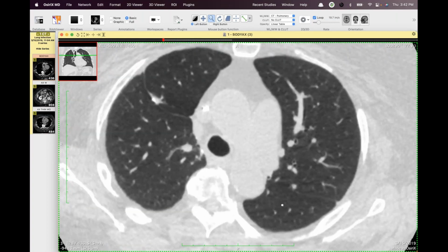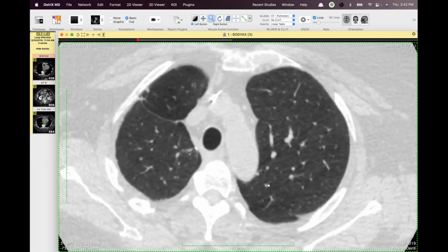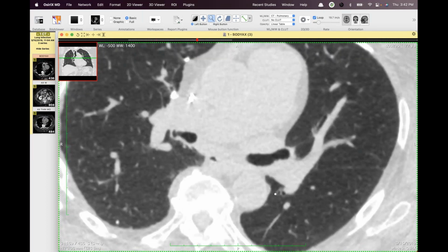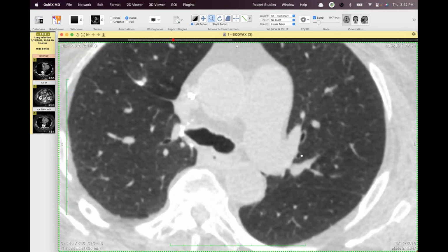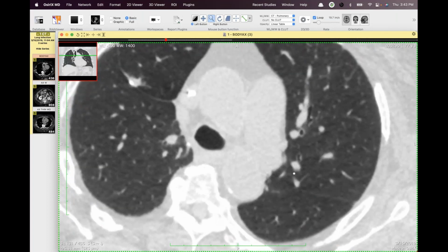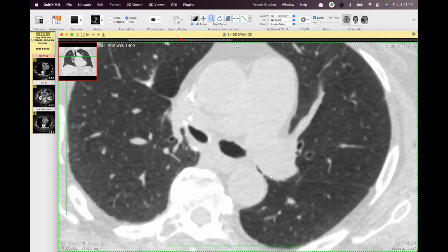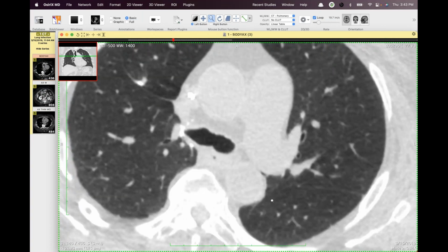And then there's a little bit of plugging more distally in that. Oh, geez. And then it supplies the portion of the apical posterior left upper lobe. And you can see that there's still, I guess this is mostly anterior, maybe some posterior left upper lobe as well, or anterior and apical, and then this is just the posterior bronchus. But I think it was just compressed between the enlarged pulmonary artery and the aorta, which caused a post-obstructive pneumonia in this area.